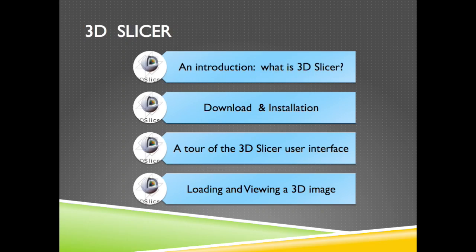In this tutorial I will give a general introduction to the 3D Slicer, then we will learn how to download and install the 3D Slicer. I will also take you on a tour of the user interface of the 3D Slicer, then finally of course I will show you how to load and view a 3D image in the 3D Slicer.